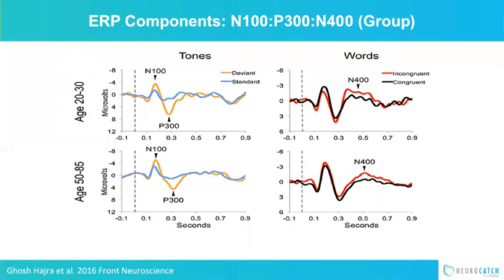Now, NeuroCatch will give it in radar plots, and I'll show you those later and make it easier. But for boot camp training, what we want to do is get you to start to be used to seeing the features in these waveforms. So we take them from looking like squiggly lines on a page to I can spot these responses. So let's start first with the top left-hand corner.